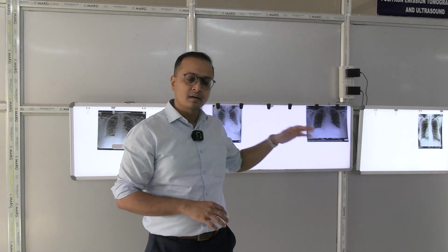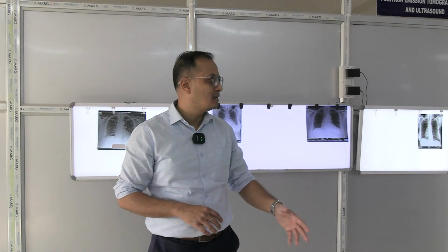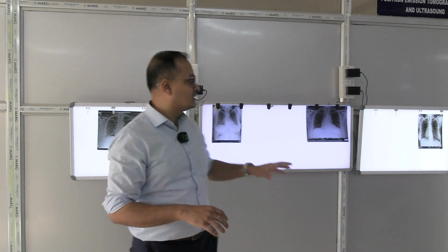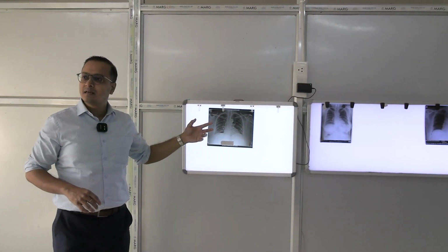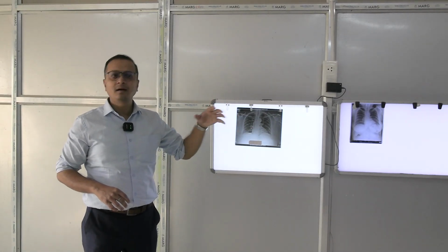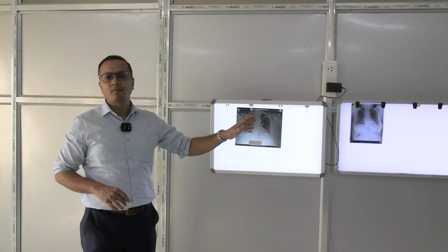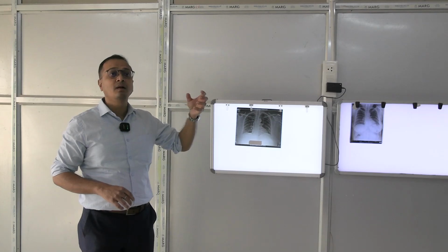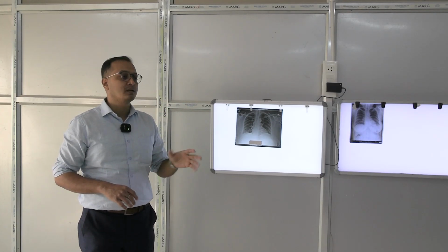Here, for undergrads, for the exam which we are going to face, it is the normal X-ray plate, which does not have any special characters. In the plates you are seeing here, there are three shadows: black, white, and in between black and white, the grey shadows. So, either three colors will be there. Anything beyond that, if you see something brighter or something visible like blood vessels, veins, etc., that makes this X-ray plate a special X-ray plate.